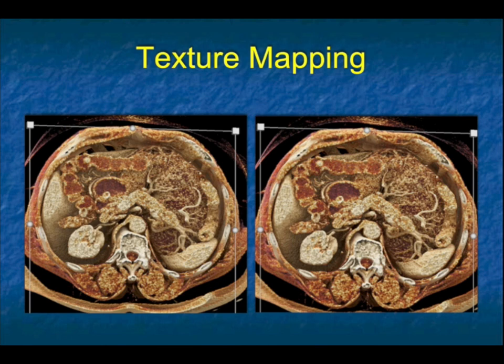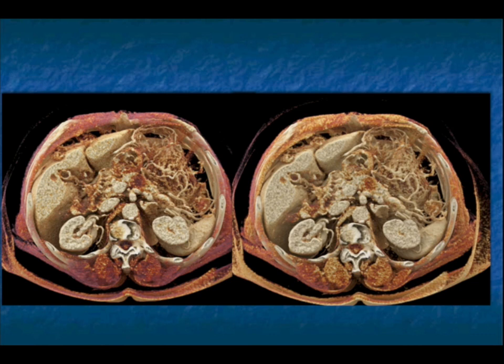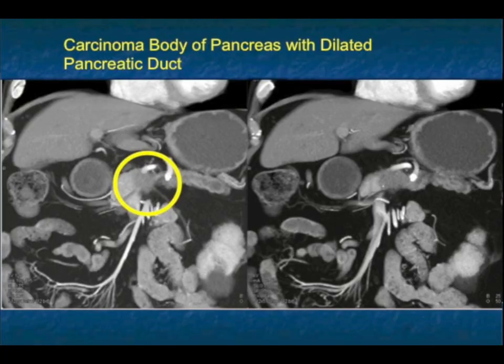So in that case, on the earlier phase imaging, the earlier time point, you could see the textural changes by the head of the pancreas toward the body, and that was the patient's tumor. So you could have diagnosed it earlier. Of course, 4 months later, the textural change is very obvious, but our goal is early detection, and we need every tool to be working for us to make that indeed happen.